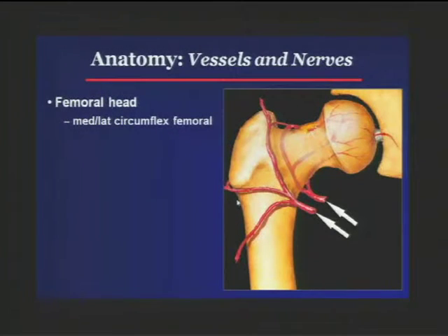Now, in terms of vessels and nerves, we don't see these directly, but we can see the effects if there's trauma, AVN, etc. We have the medial circumflex femoral vessels.